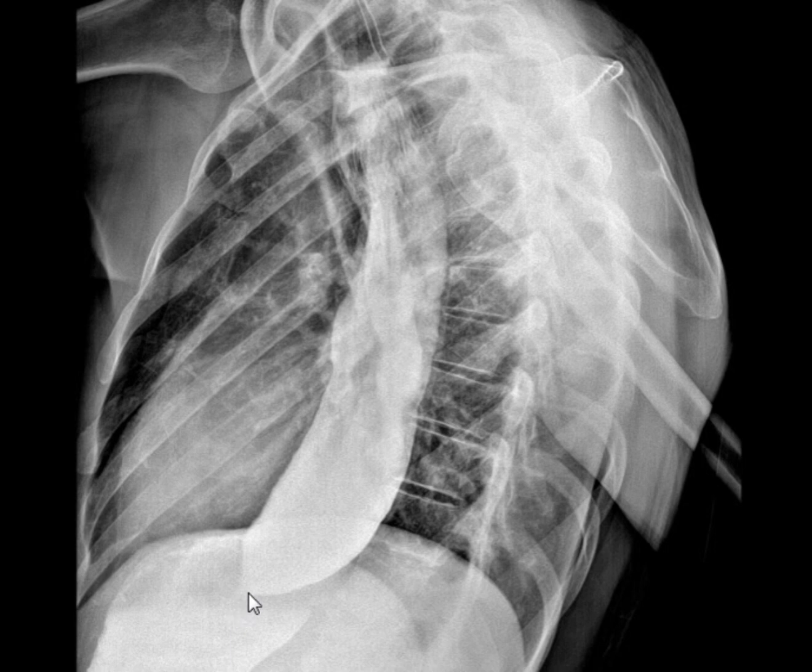The cause of narrowing? What's your differential diagnosis, let's say? It looks like achalasia. Why achalasia? Why not, I don't know, gastroesophageal carcinoma, for example? Can we exclude it from here? Yes, we can. And there are not one, there are multiple clues to the exclusion. Give me these clues.